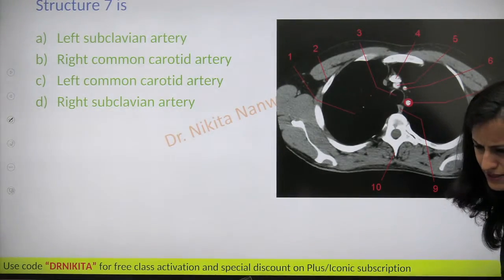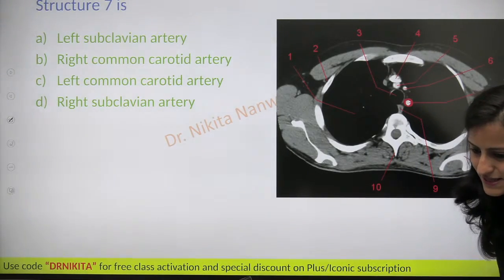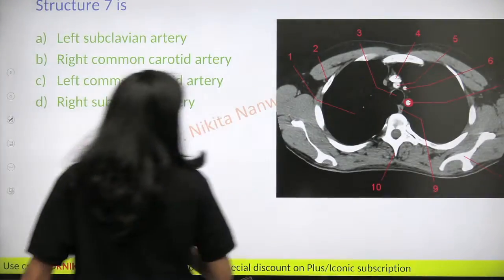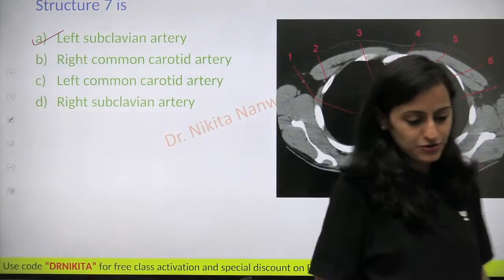Okay, many of you have got that right. Very good, Sneha, Sudha, Milind, Anil, Lakshmi. Let's see, this is not your left common carotid. It is your left subclavian artery. Okay, this is your left subclavian artery.